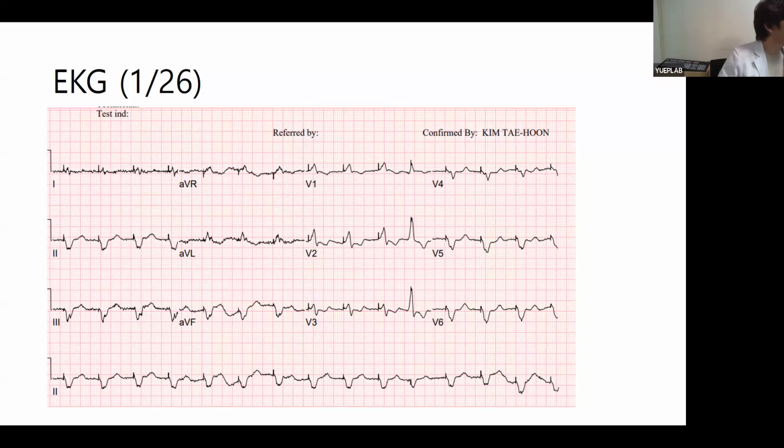So I think all the QRS morphology shows that the patient's condition and heart condition are very, very poor. There is no absolute cutoff value, and I think the patient's condition is not that good, right? Yeah, very poor, and also VT.